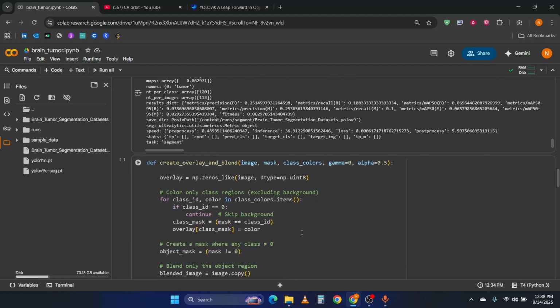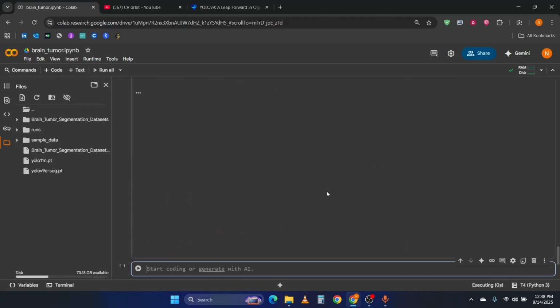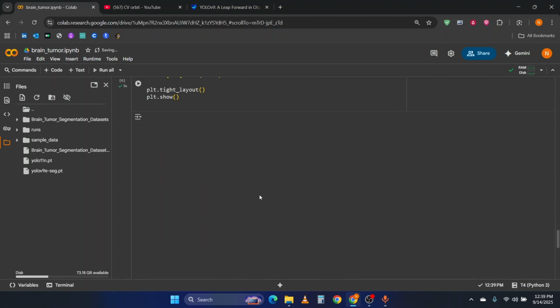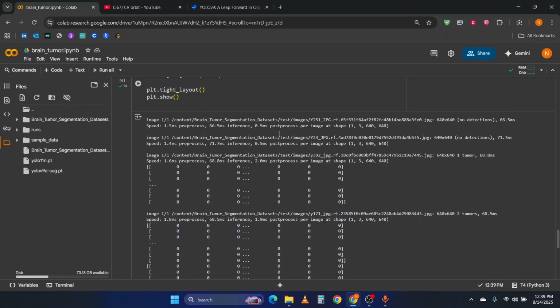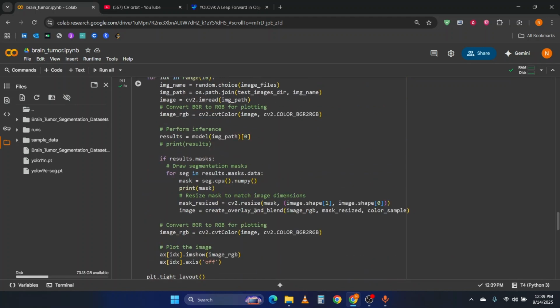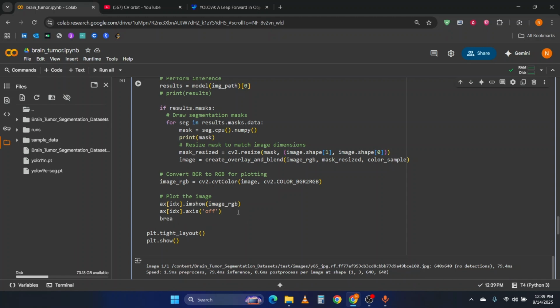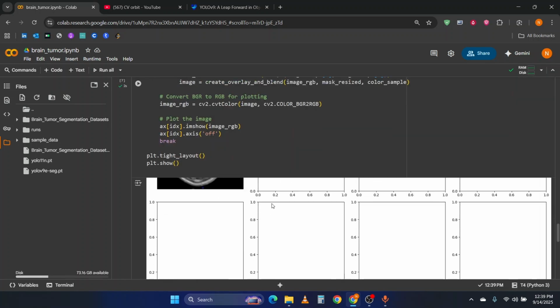So our training is completed. Now let me run this, and now let me run this also. See here, 0000. You can see this is a mask. But let me break it here, just for a single explanation. Now let me run it again.